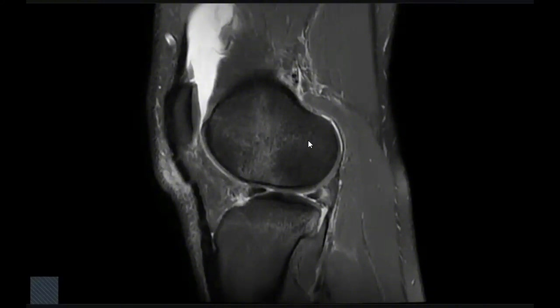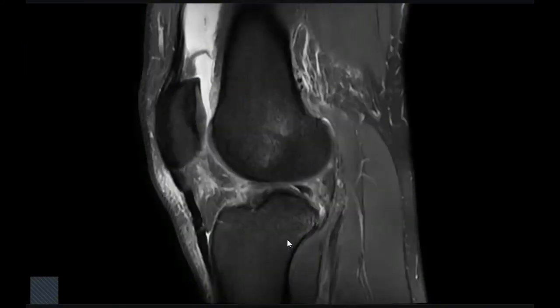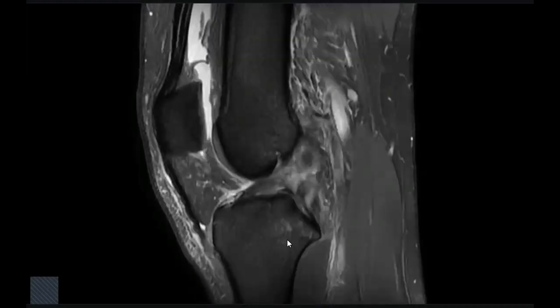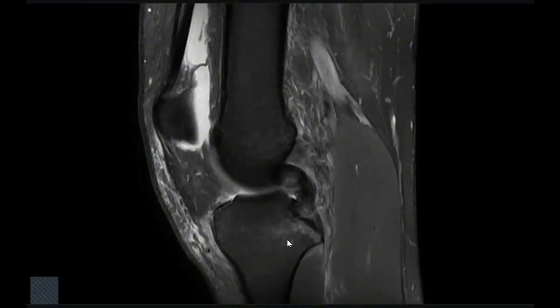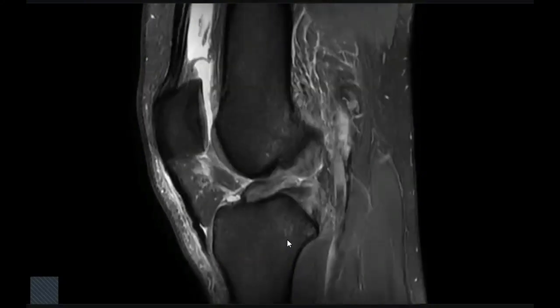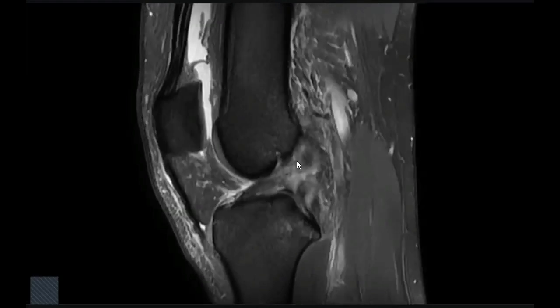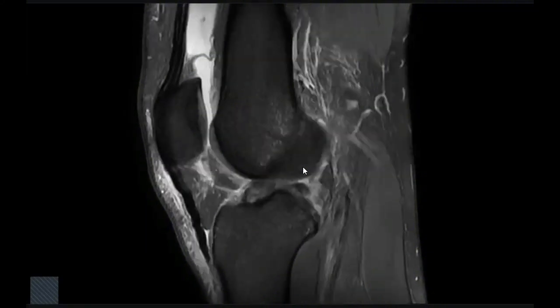What are you assessing in the sagittal? The menisci first, from the lateral anterior horn to the posterior horn. Then I assess the patella, the quadriceps tendon, and the patellar tendon. I'm going centrally to check the PCL. It appears a little bit sagging. And the ACL: here I can see a high signal within the ACL, and I can't see continuation of the fibers, which is suggestive of ACL tear.